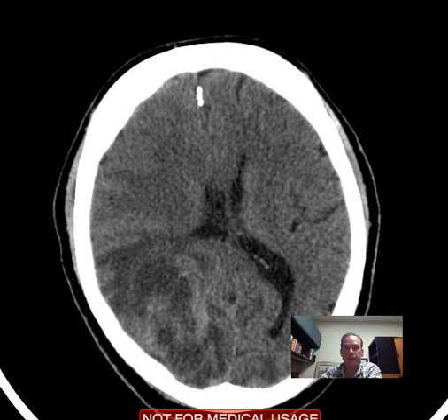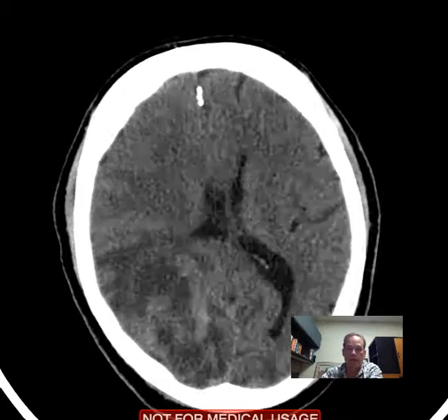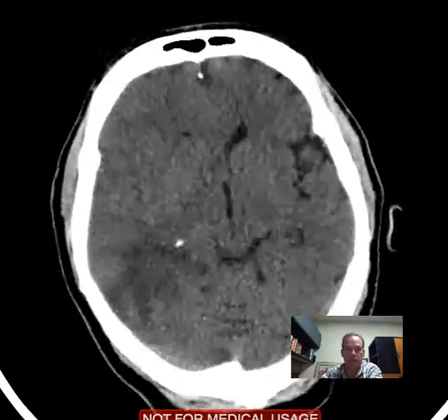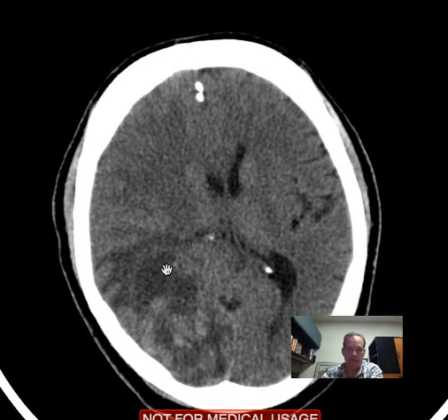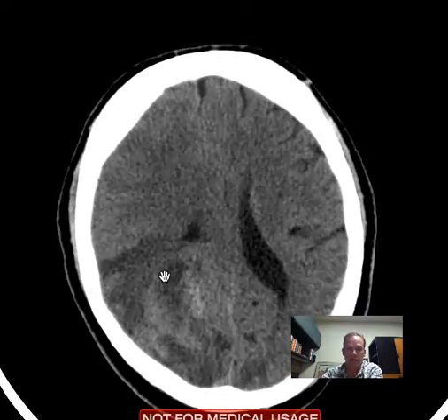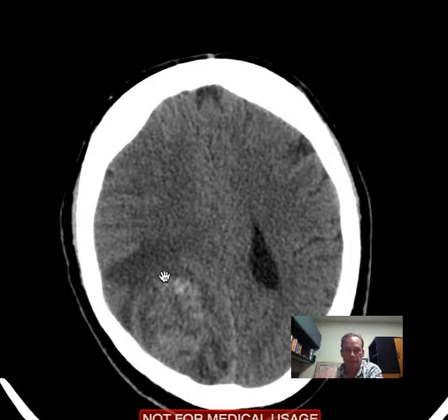This is a case of a 68-year-old male who came in with loss of orientation, difficulty ambulating, just not acting himself. And looking through this head CT quickly, we see a couple things. One is there's a large abnormality here, and this is the primary abnormality. Now, we won't go into a lot of detail about this because the focus here is thoracic imaging.